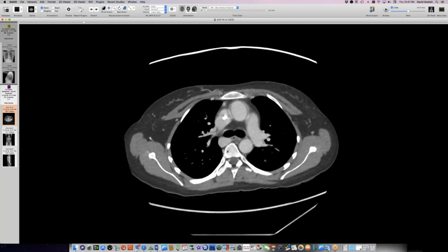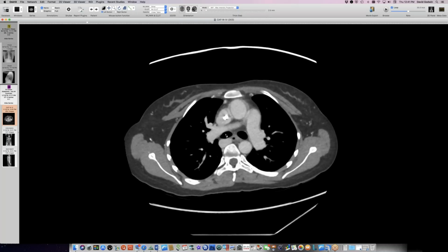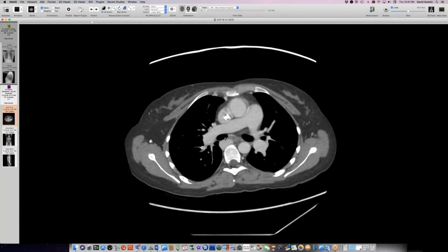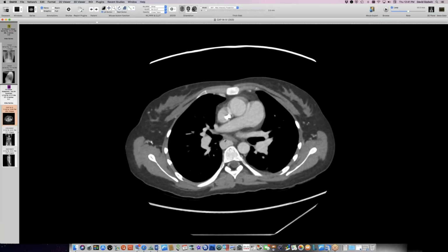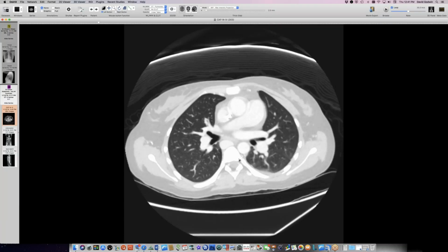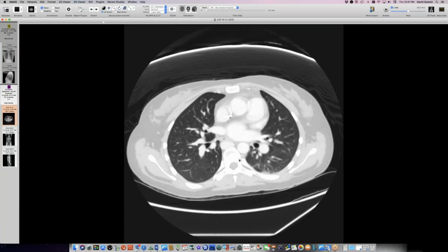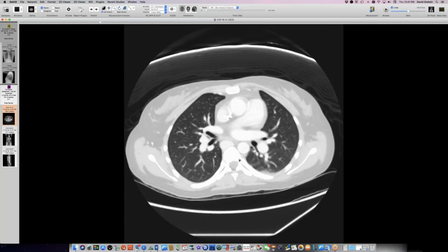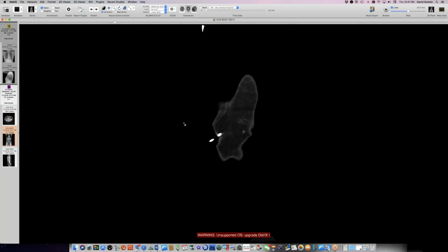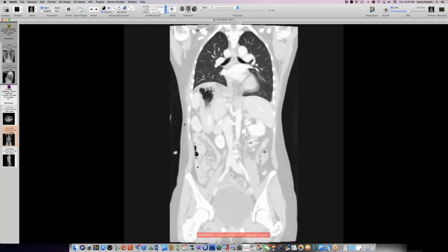But what we don't have is an upper lobe coming off promptly here. I mean, it seems to go a long way before it branches. So that is another anomaly. Now, is this the right upper lobe bifurcation there? It's not. So the bronchial anatomy is messed up here. Let's check it out on coronal. Looks like we have two lobes, maybe just two lobes.